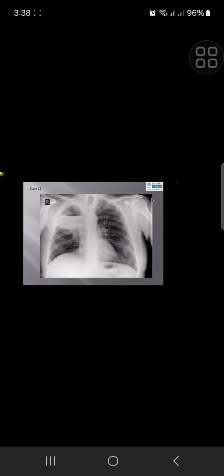Yeah, I was thinking, but this doesn't look like air crescent, like a crescentic sign for aspergilloma. Just that the walls of the cavity are merging with surrounding consolidation. You're not seeing the walls of the cavity. It's a cavity with air fluid level. But yes, and patient is not acutely unwell. You can't see any lung here. It's actually empty airspace, inside a lung, an empty airspace surrounded by wall, and it has got an air fluid level. So it's a cavity with air fluid level.